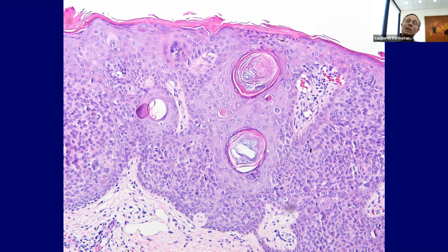Maybe this is Bowen's disease. It's a couple of atypical cells. Maybe it's squamous cell arising here. Maybe you put down hidroacanthoma simplex. Maybe people say these are poroid cells. Well, they're really not, but they're these little clones. Maybe put down other intraepidermal malignancies. Maybe put down something like Merkel cell. Maybe Langerhans cell histiocytosis. Maybe put down melanoma. So those are some other things that can involve the epidermis.